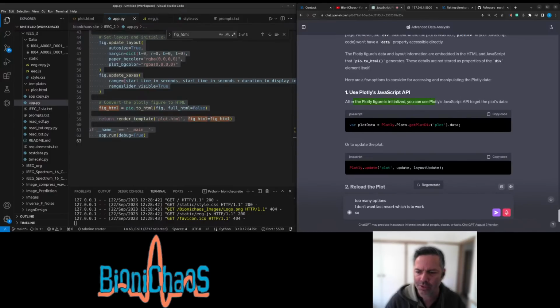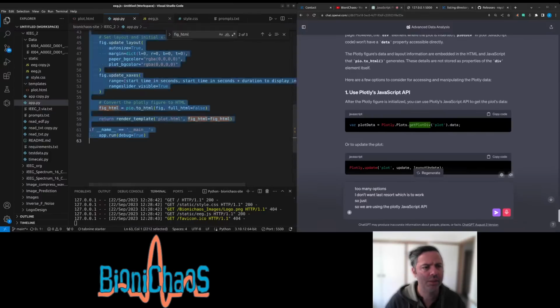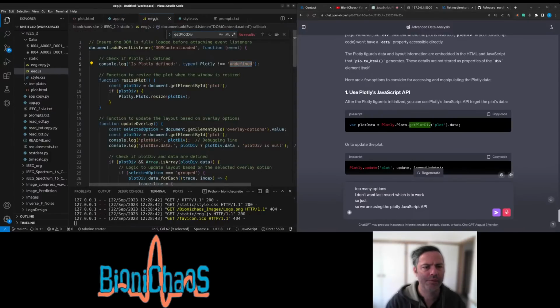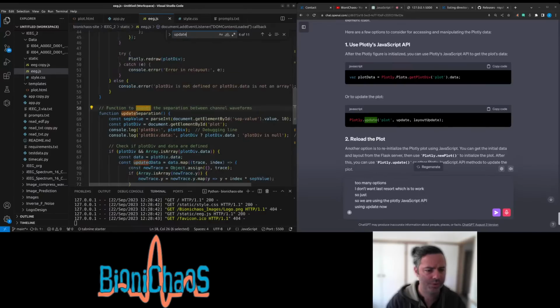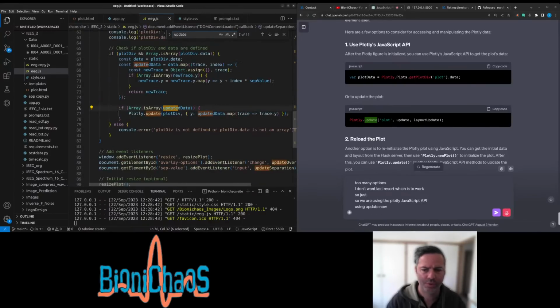So in JavaScript, how are we doing? We are using the Plotly JavaScript API. We're using update, no. We're using update.